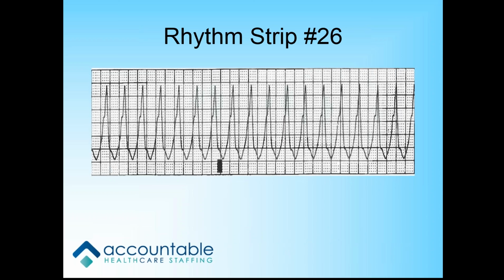Jessica. That one is VTAC. Very good. What are you going to do? You are going to do CPR and maybe give an antiarrhythmic? Shock first. Always shock first. And then move to your antiarrhythmics. Okay. Perfect. You're ready for the test. I don't know about that. Yeah, you are.